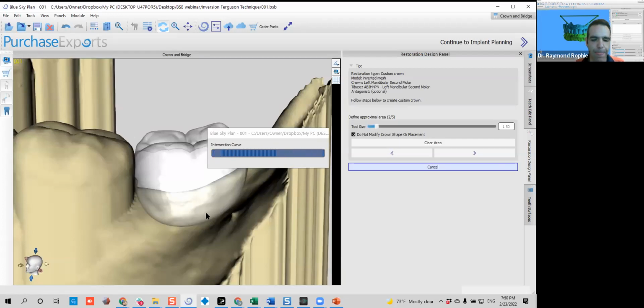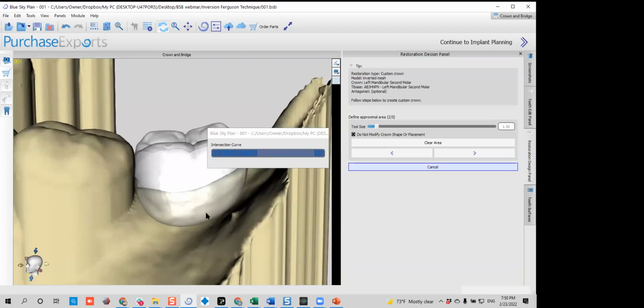Okay, good. So now this is doing a curve intersection. I want to apologize first because my computer is getting slow, but anyway, this should give us the next step fairly quick. In the meantime, I can answer any questions that might be arising.